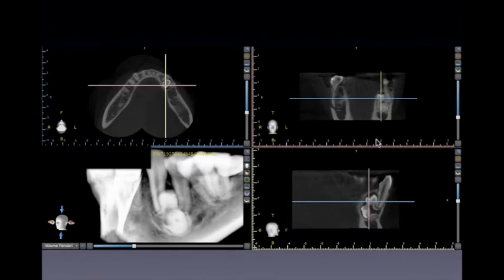But as this CT scan or three-dimensional cut shows, it appears amorphous because it overlaps the image. What it actually is a supernumerary tooth that has a gemination, two crowns over one root impacted, and that's why in two-dimensional images it appears amorphous. But in three-dimensional view, you could clearly discern the shape of one crown to another.